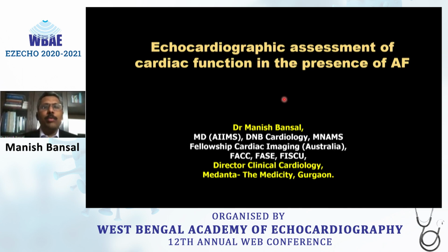Today, I'm going to talk about echocardiographic assessment of cardiac function in the presence of AF. This is something which is important but quite challenging.